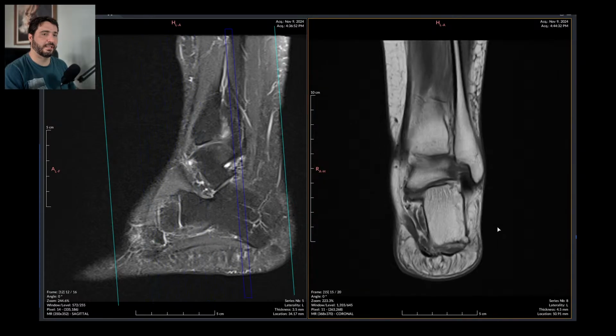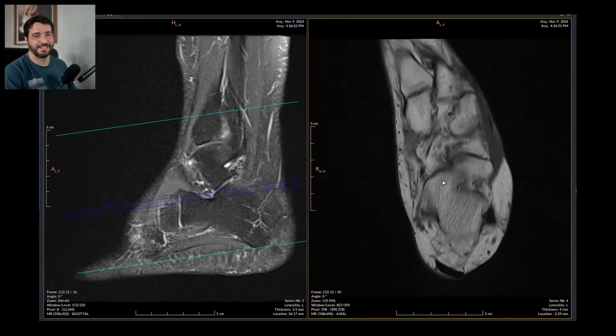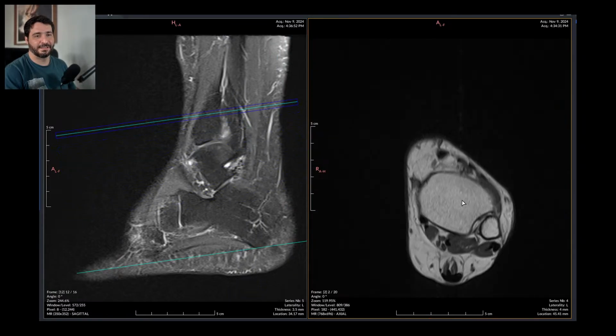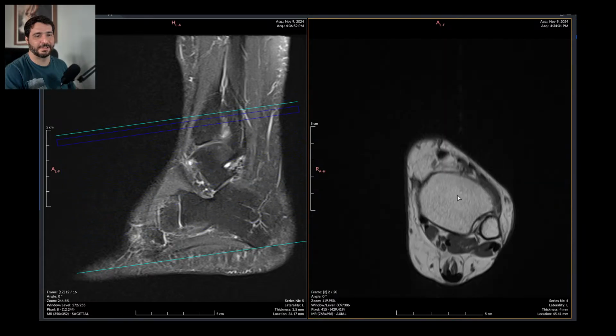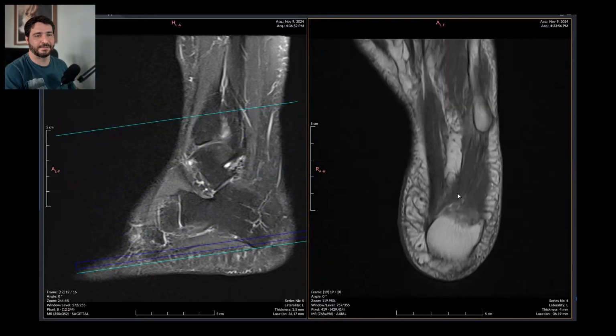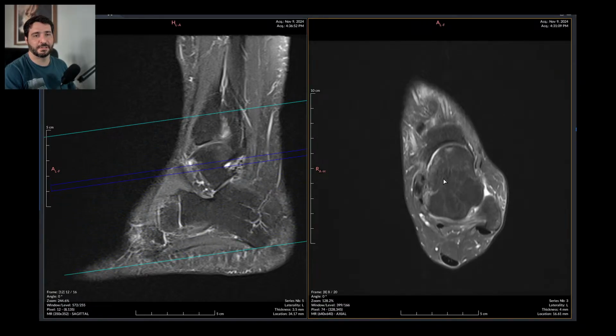Muscles seem fine, as much as it's possible to tell, because this is just really, really bad, as most of the times it is. So we gotta just get used to it, keep on pushing forward.